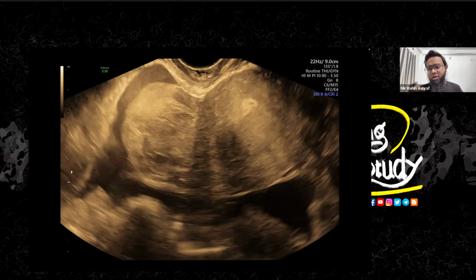Like you are looking at the renal parenchyma, you are seeing a calcified structure. This is the calcification. Like you are seeing a calcified structure within the wall of the gallbladder, this is calcification, but within the lumen, it will be a stone. So lumen means stone, parenchyma means calcification. Both are calcified structures, actually.